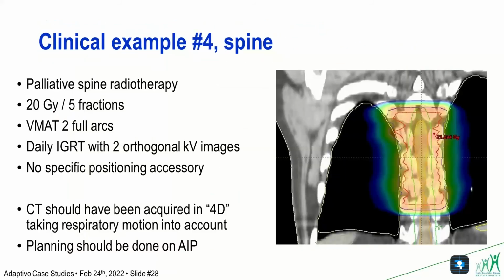Finally, the last clinical example of today is a palliative spine treatment of 20 grays, 5 fractions, VMAT, daily IGRT with 2 kV images, and no specific positioning accessory.